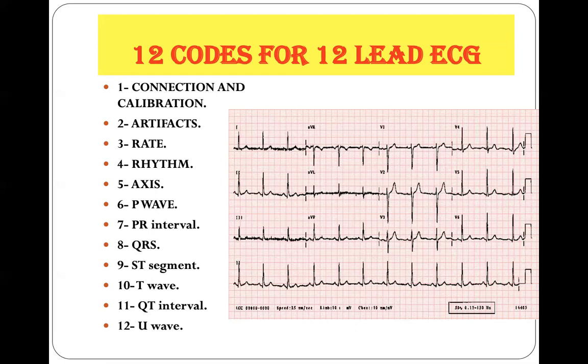By following this stepwise approach, you will interpret the ECG in an accurate manner. You will be able to obtain as much knowledge as you can, interpreting the ECG in the background of a clinical context to reach a provisional diagnosis and confirm it with other diagnostic workup.